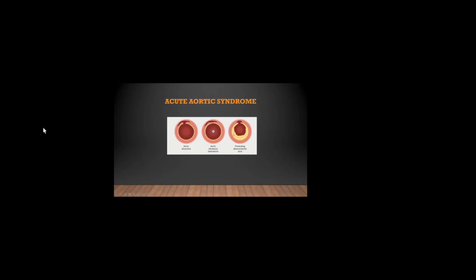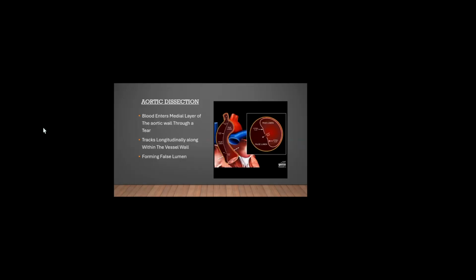We could see this yellow. This means there is an unhealthy intima, showing atherosclerotic changes, irregularities, so it's not smooth anymore, similar to the other cases. And those irregularities usually get ulcerated. Sometimes they rupture and dislodge or cause some emboli. And then sometimes this ulcer just erodes in the aortic wall, goes through the intima and goes outside the contour, as we will see in the next slides the different entities and what are the imaging findings that we can see. So let's start with the dissection.